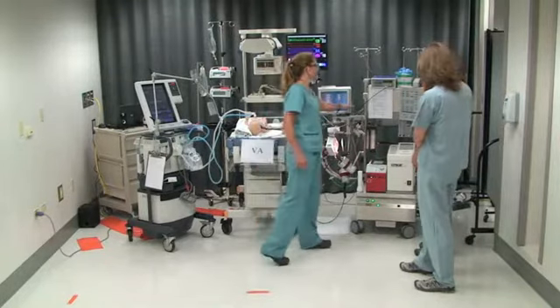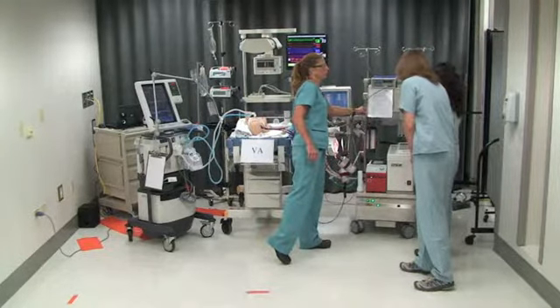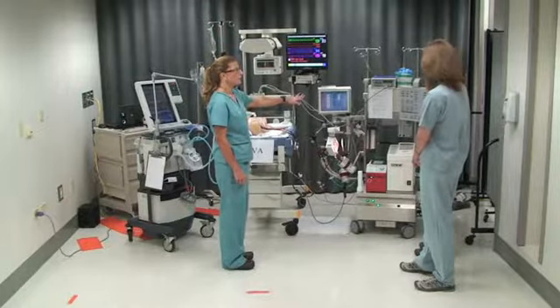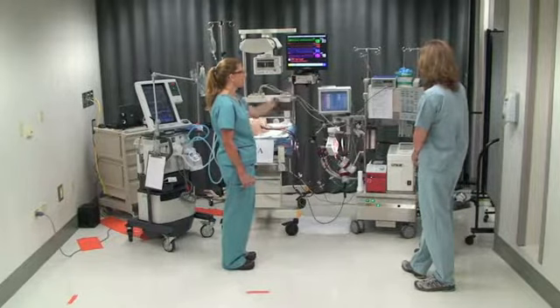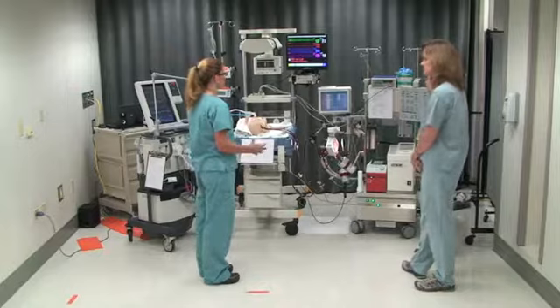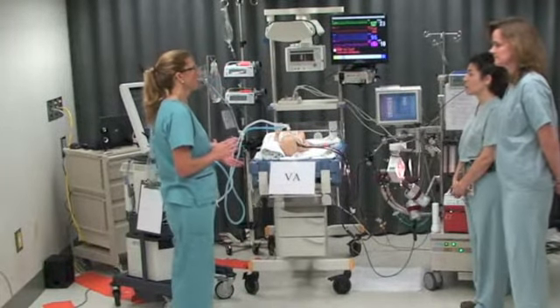We also have daily parameters, so this would be like having doctor's orders. Gas flow, you have sweep gas, your pump is on, clamps at the bedside, flashlight, gloves, all the things you would need to do a circuit check. We have some scenarios that we're going to let you practice on.